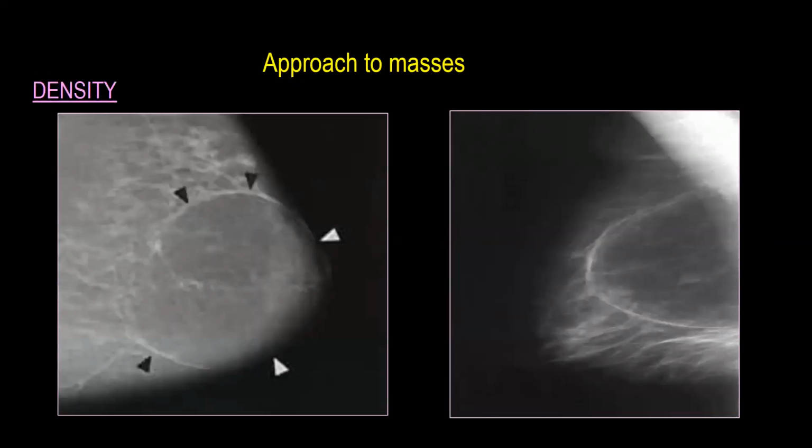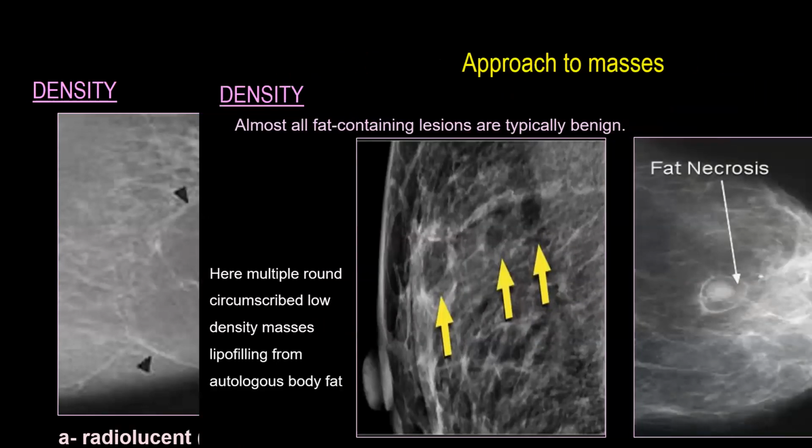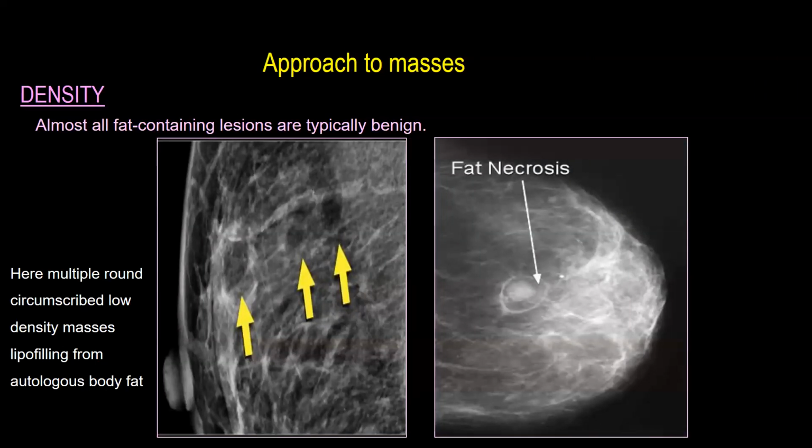Okay? Again, I'm dealing with a large palpable mass, homogeneous, radiolucent with a thin capsule. Most likely it will be a lipoma. Lipoma. Yes, a lipoma. Again here, I have a fat necrosis seen as a mixed fat contained mass. You see, lucent mass and central opaque.